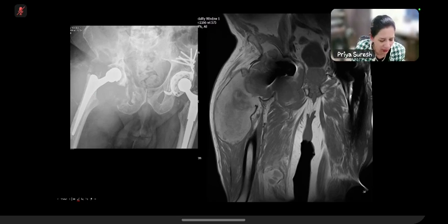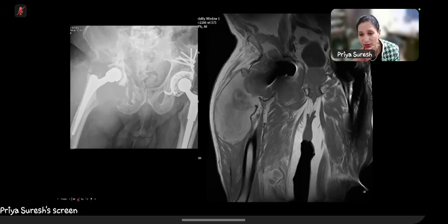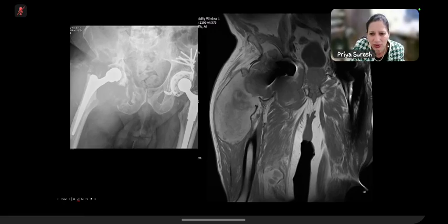I remember that it was reported as a destructive bony lesion, likely metastasis, and the patient went on to have a CT, and I was like, no, this definitely, because you can see the start in the previous radiographs, so this definitely has to be a pseudotumor. So we did an MR, and you can see the low signal intensity outlining the lesion.